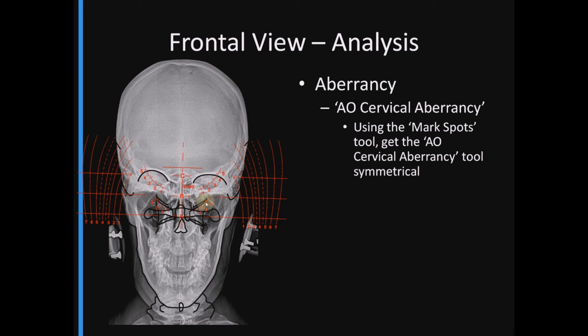And we're going to bring the template down and set the arc on the condyles, centering it to the outer 2 dots. And we're going to center it to the points on the template that are in agreement. So you can see here this dot, for example, is sitting just inside the number 3 tick on each side. So the aberrancy template would be aligned to the perspective of the condyles.